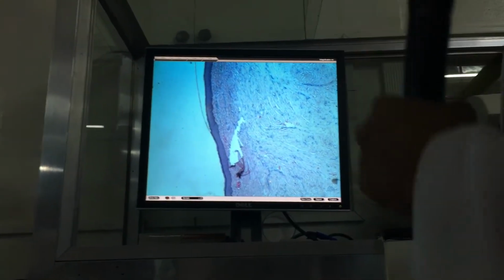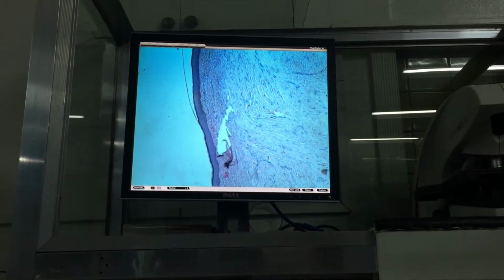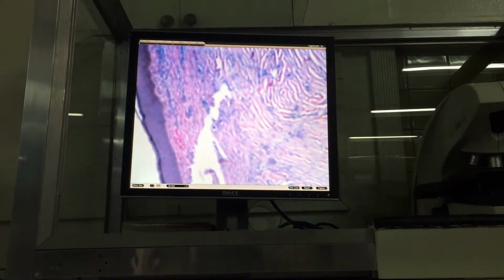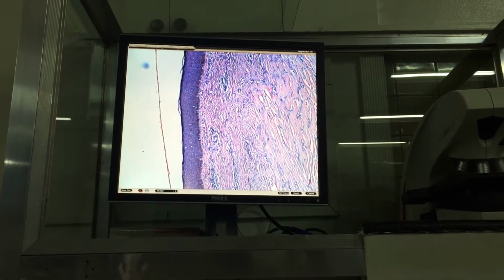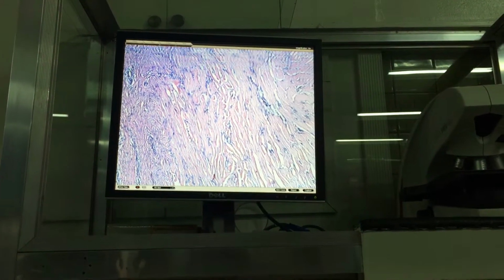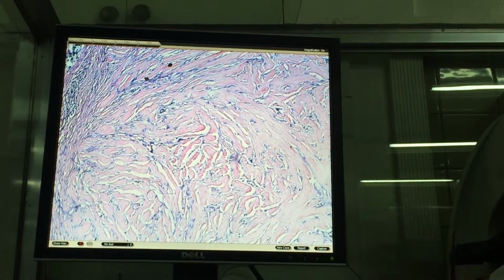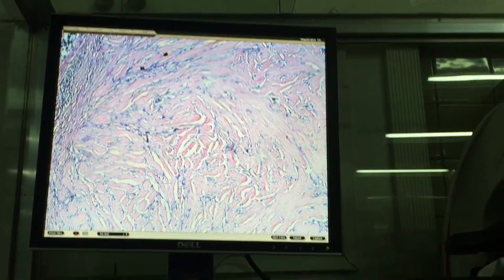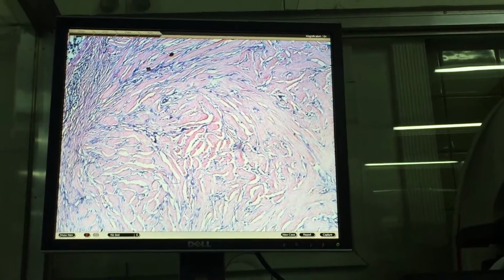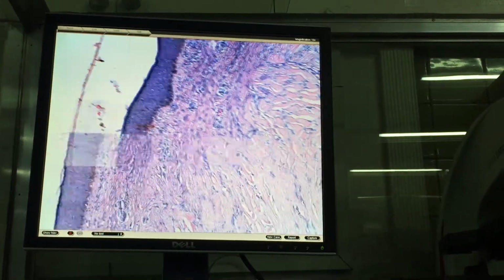Okay, what's the lining epithelium here? Okay, high magnification, stratified squamous epithelium. But what's important is underneath this. What are these pink hyaline areas here? I think everything here is bundles of pink material. What are those underneath the stratified squamous epithelium?